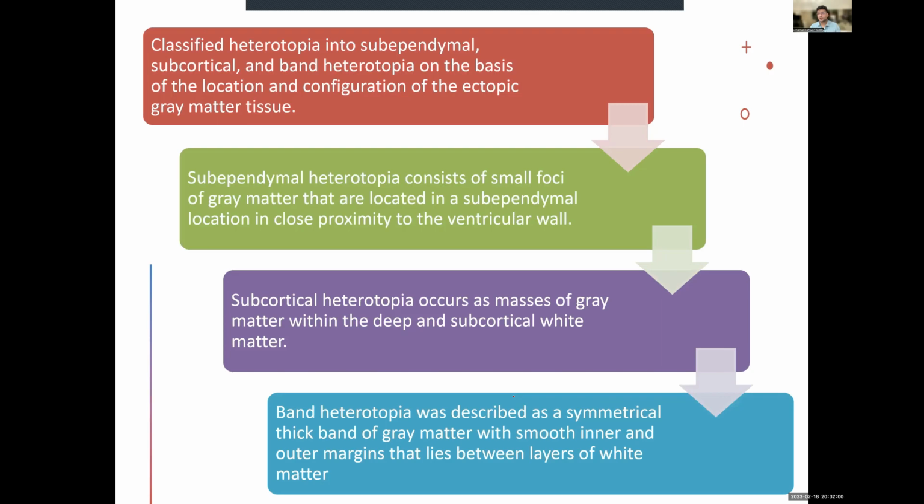Generally, subependymal nodules can show calcification and they may show enhancement in 10 to 25% of patients, which is unlikely here, as the lesion follows entirely gray matter signal. So a small focus in the ventricular region is commonly seen. So this is called heterotopia. Very commonly, we have observed heterotopias which are often missed at the atrium of the ventricles in the peritrigonal region, one of the commonest locations.